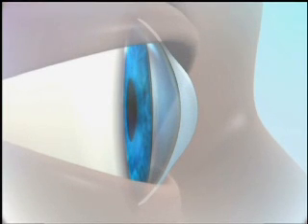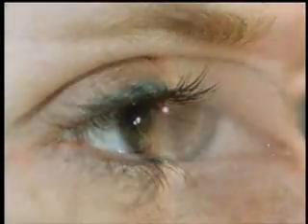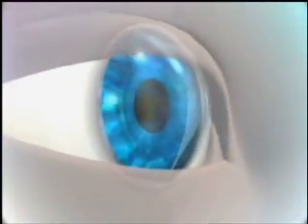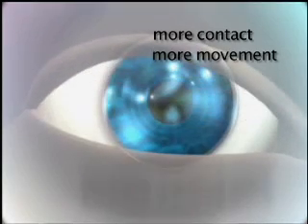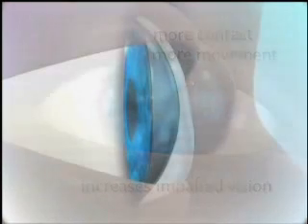To understand why this makes a difference, you need to remember what happens to an eyelid during a blink. In the split second of each blink, the top eyelid comes down over the cornea, while the lower lid pulls in towards the nose. During a blink, the eyelid makes contact with areas of changing thickness on a lens, causing the lens to move. The more contact between the eyelid and the lens, the more movement. This can give astigmatic wearers fluctuating vision.